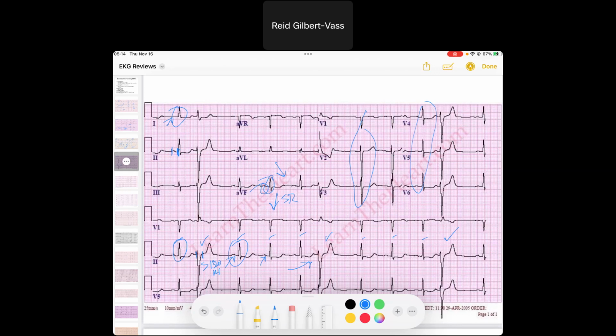And if you look in front of them, I'm going to use this one, I'm looking for atrial activity. And so I'm going to compare the T wave of the previous beat right here to this T wave and see, do I see any P wave buried? Because sometimes if a P wave was somewhere right in there, it would be the cause of this QRS, but I don't see any differences. So I don't see any P wave. I don't see any atrial activity that is driving this premature beat.